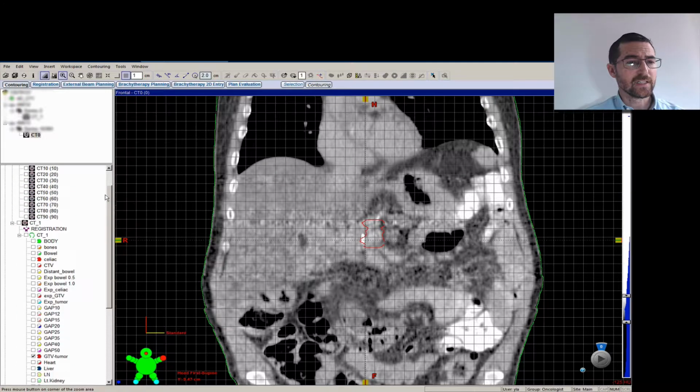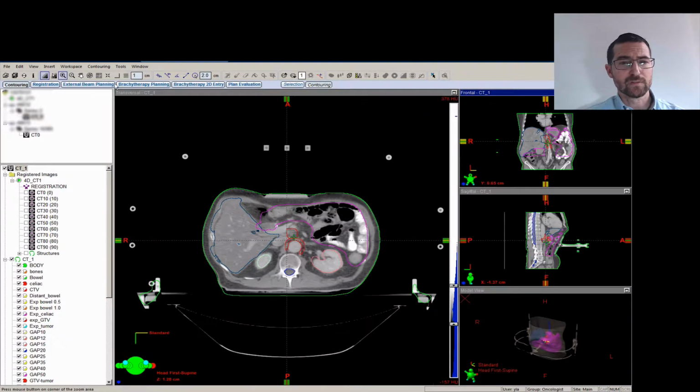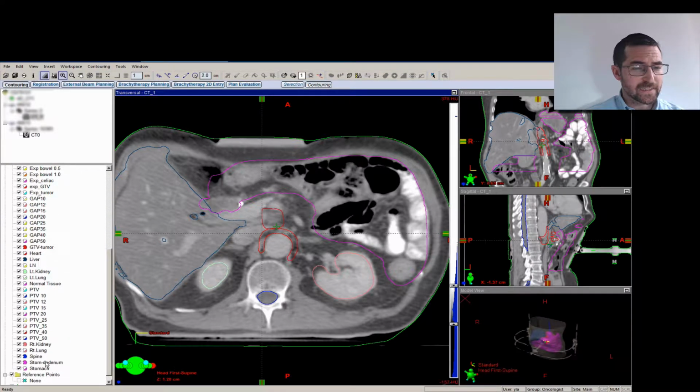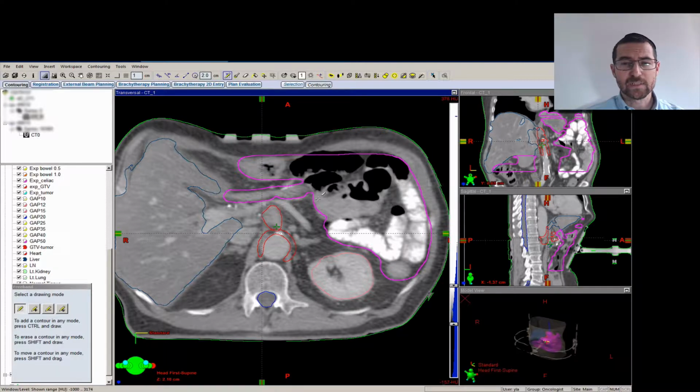Now let's go back to the 3D simulation film. Take off this grid view. Zoom up. I do it in real life, and I just keep on looking at my bowel contours, just to make sure I haven't missed anything. Because we're about to expand it, and any mistake now will, yeah, so here I can see that we missed a little bit here.